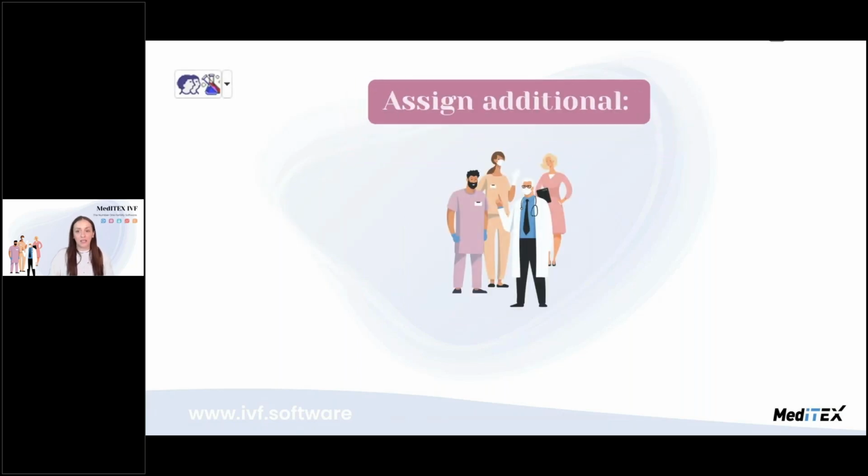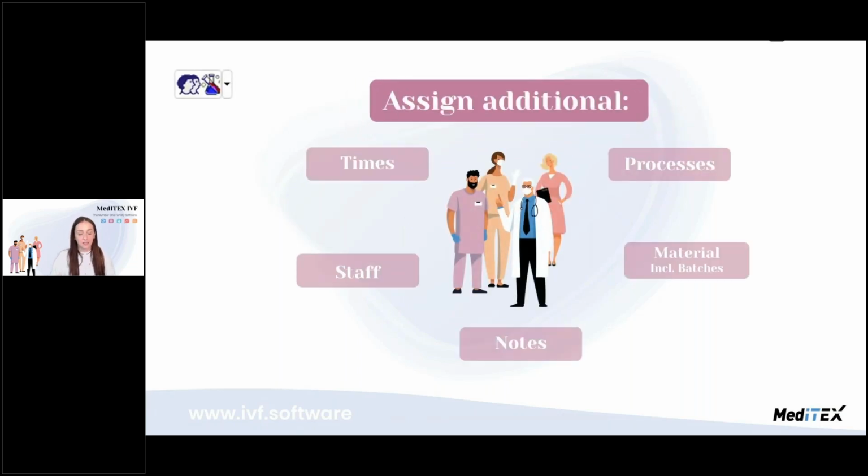With this button, you can additionally assign times, staff, notes, processes, material, of course, inclusive batches. And this gives the clinics, especially since you also saw from the very beginning that we have clients in 54 different countries, every clinic works very differently and very individually. So MedITEX IVF is not a fixed program. It allows you to adapt your workflows, your needs to it, which is very important. So you can play with it and really try adding your own workflows to the system.